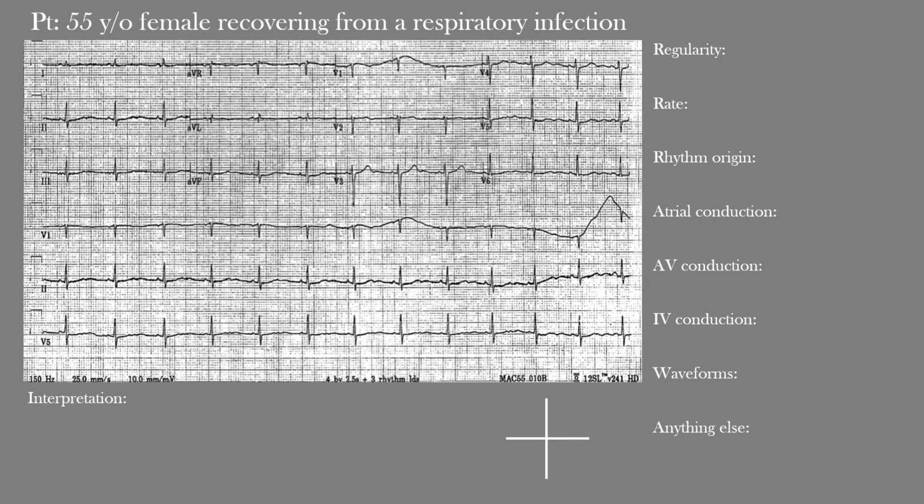Now, I want you to pause the video and take a few minutes to go through it yourself. When you're ready, start the video and we'll take a look at this.